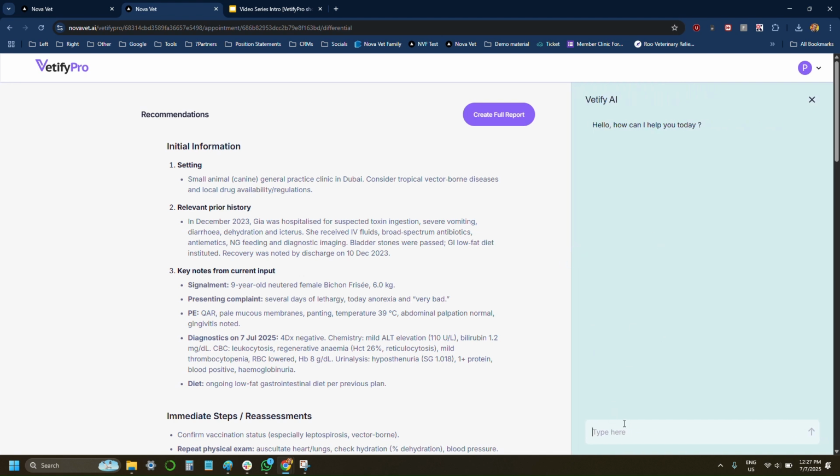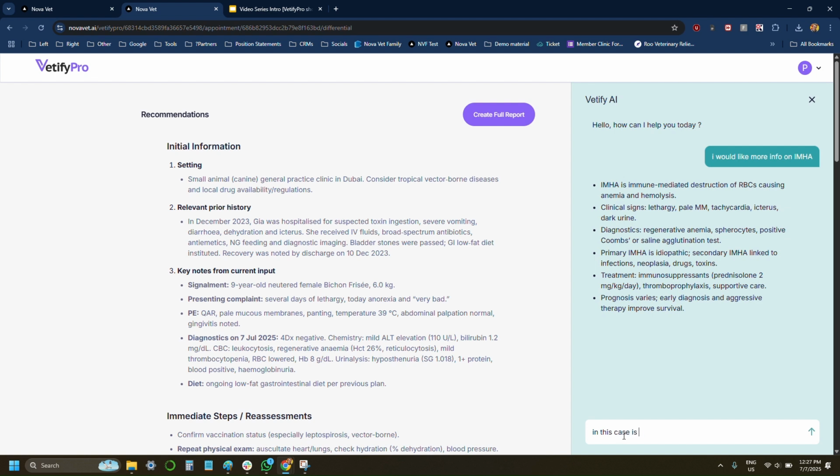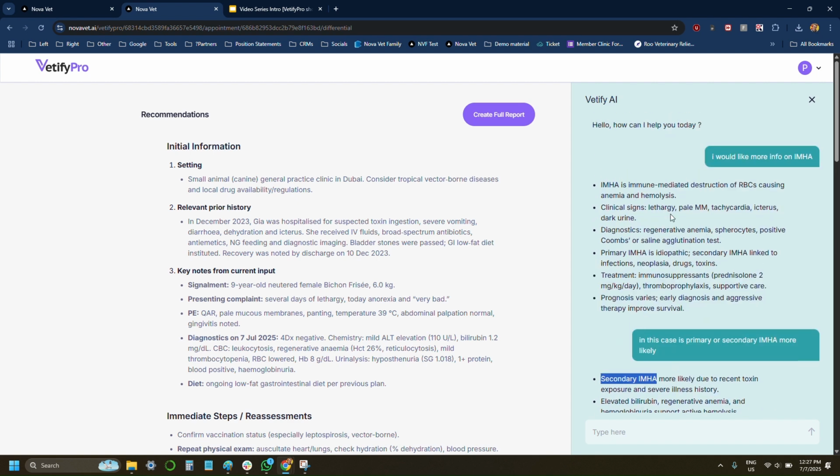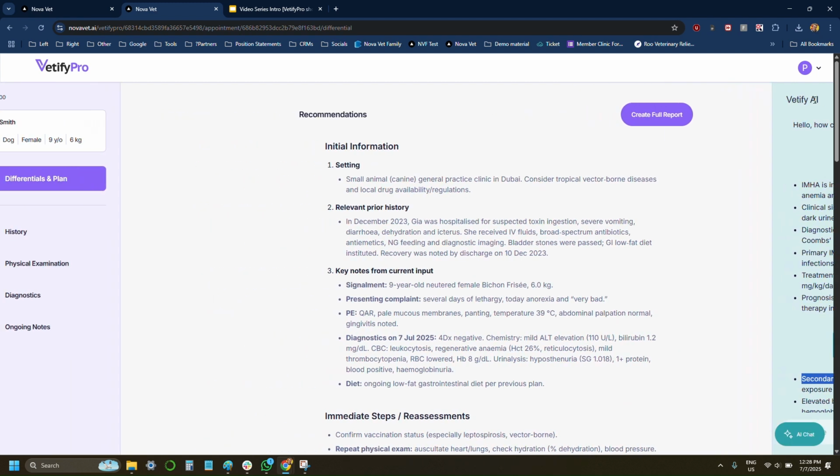So here we can write anything. We could write, I would like more on IMHA. So sort of your textbook type questions. Or specific questions based on the case at hand. So is primary, okay? So once again, you can ask specific questions about the case, or you can ask general questions as you would from a textbook. So that's very nice to have in combination with the rest of the results.